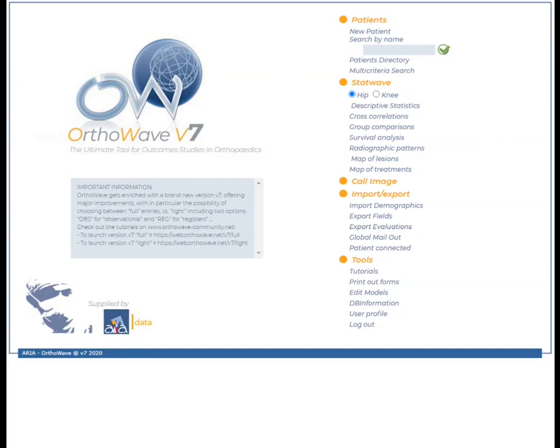The home page of this user section includes the main features of the software, i.e. patients, the integrated statistical tool, the catalog of images connected to the files, the data import and export functions, and the software usage tools. Let's address the management of a new patient.